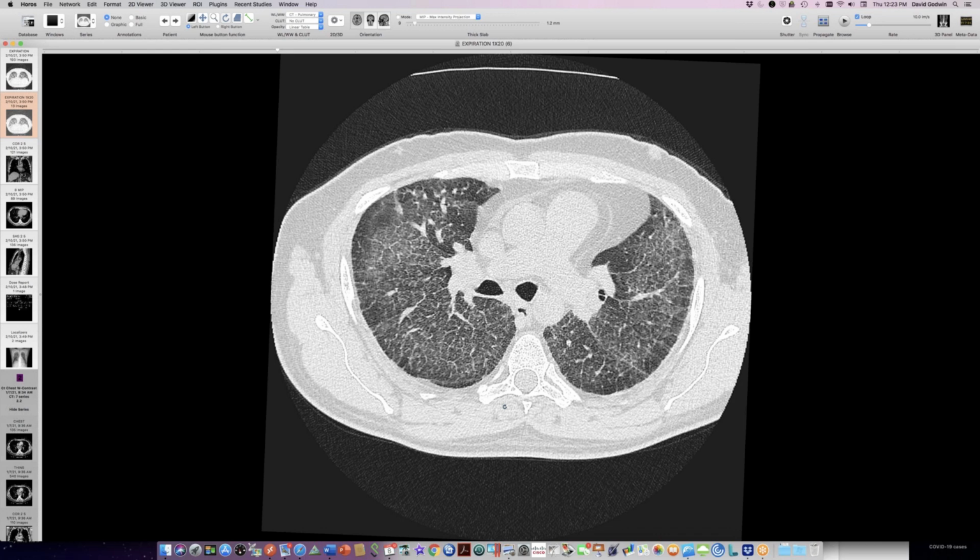It got better on steroids. This is better than before. It's less dense, fewer septal lines. Well, and then once he was taken off the steroids because he didn't like the effect on his muscle wasting, it all came back, and it's now as bad as it was in January. Well, David, I would argue the improvement argues against a storage disease, since steroids don't make that enzyme magically appear. I was hoping maybe they did. Okay. So how old is the patient?